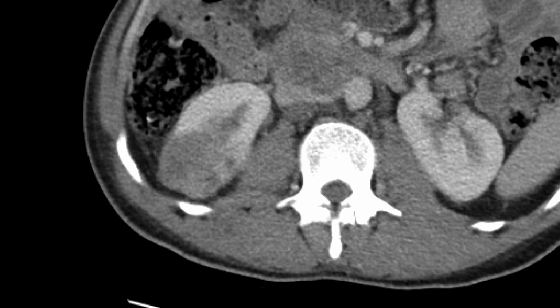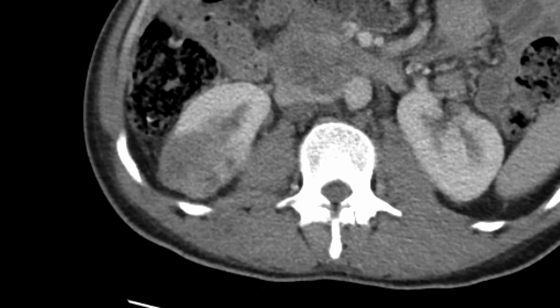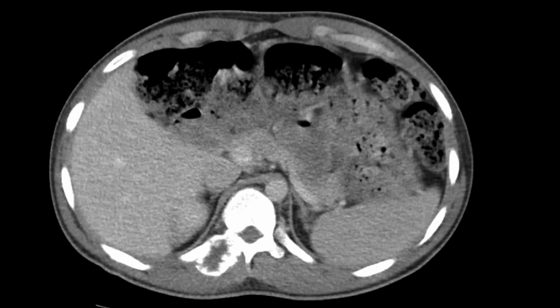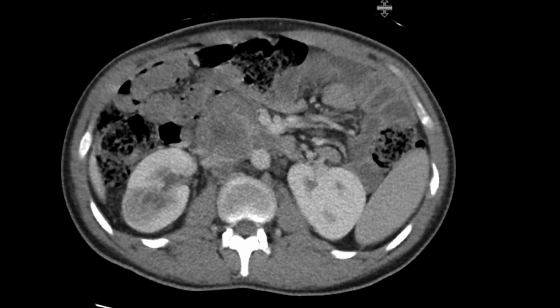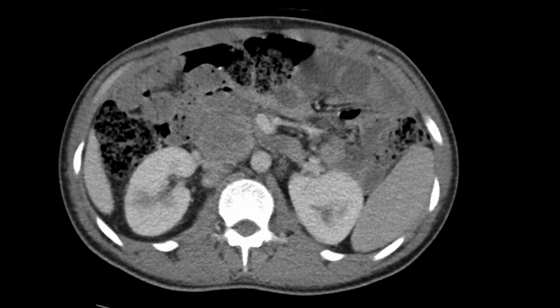So a young patient with this very heterogeneous mass that is somewhat infiltrative, somewhat expansile in terms of the space in which it's occupying within the renal parenchyma. But if we look closer, we also see other disease over here. Right around here, we're seeing a big retroperitoneal node that's almost as big, if not larger, than the kidney itself. We see other retroperitoneal adenopathy, this here being a retrocaval node.